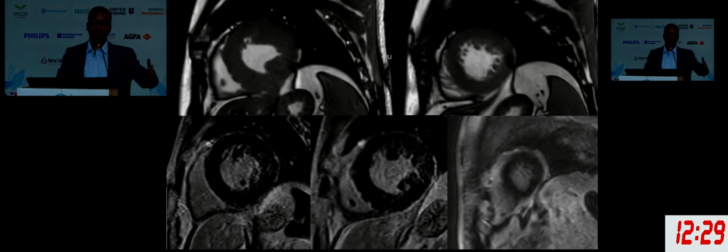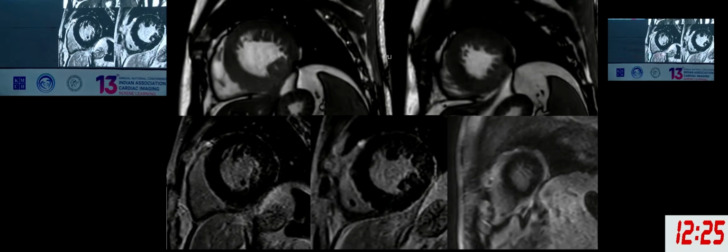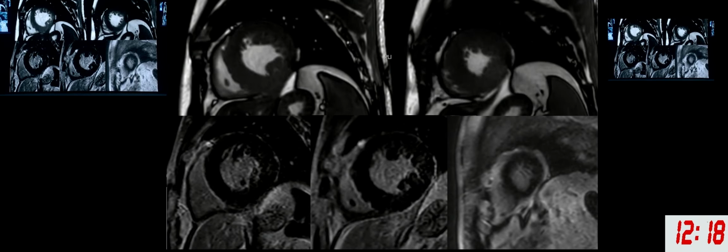Few of you. How many of you think this is hypertensive hypertrophy? Just because I gave you one BP measurement. Okay, so this is where the problem comes. How do you report this? What do you end up saying?